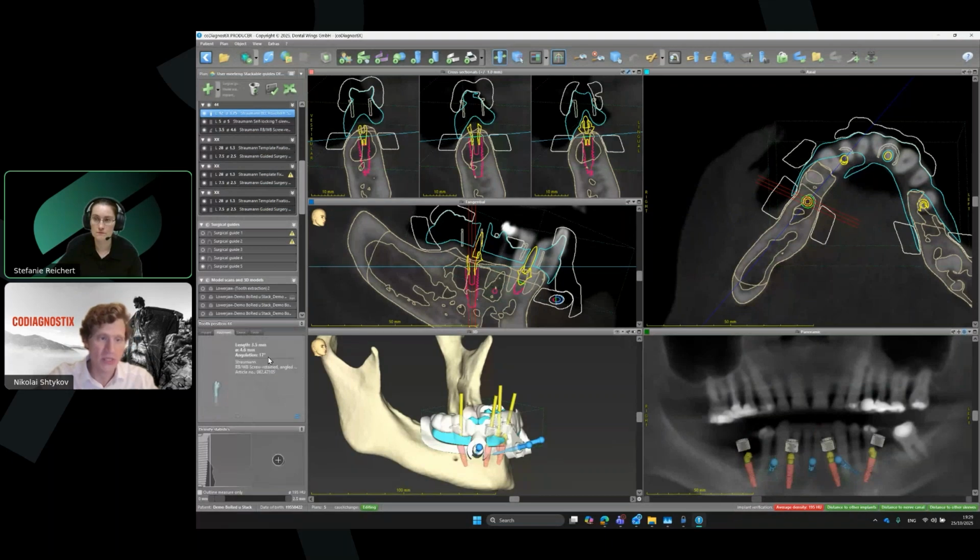It is 17 degrees. And because I can choose the position of the screw of this cylinder, I subtract in the following direction, not from the implant. I subtract it from the abutment direction.